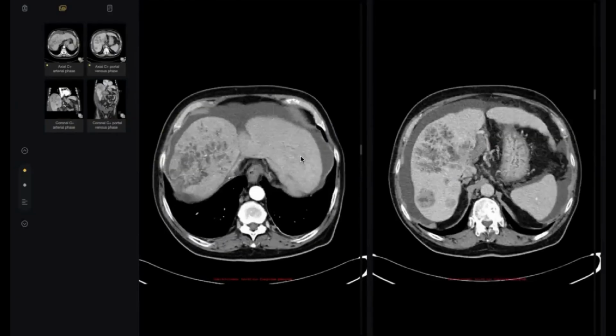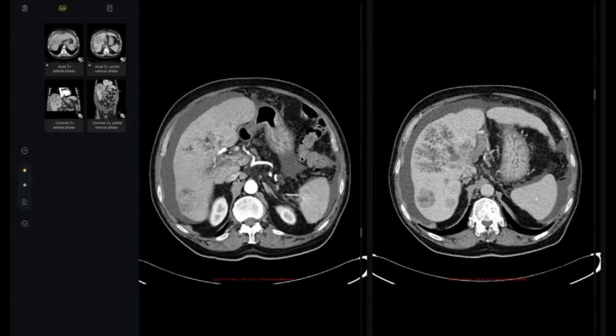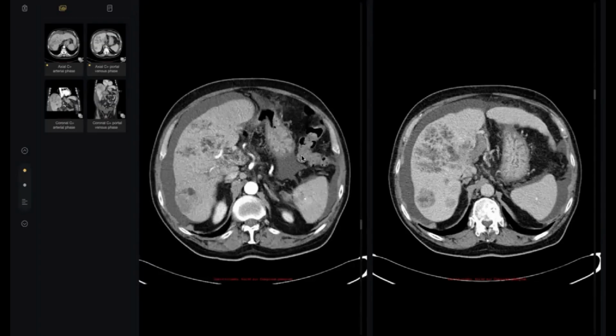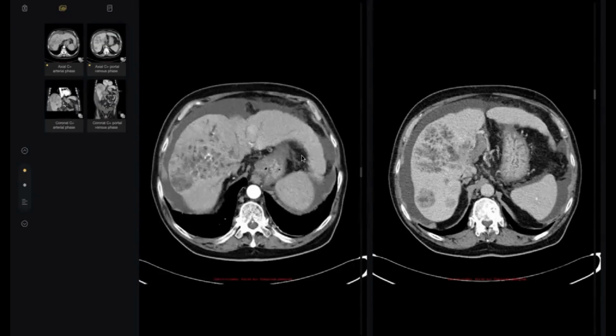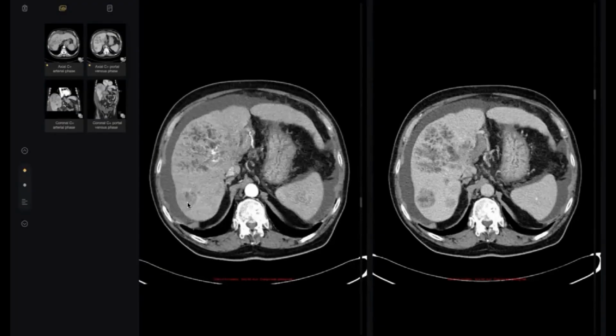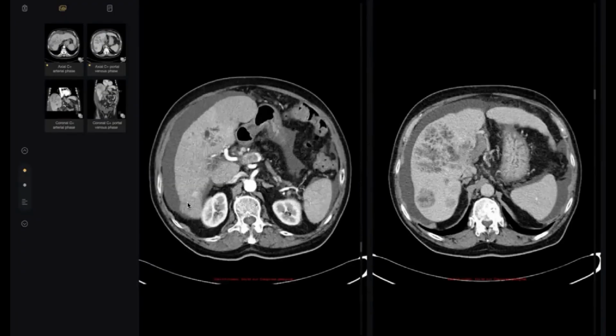Try to start from the core. I said many times before, the examiner gives you one case with a dedicated pathology in his mind, and wants you to start with it. What happened here? My colleagues, this is a cirrhotic liver showing multiple heterogeneously enhanced lesions infiltrating the right lobe. One, two, three. There is one in segment 6 here.